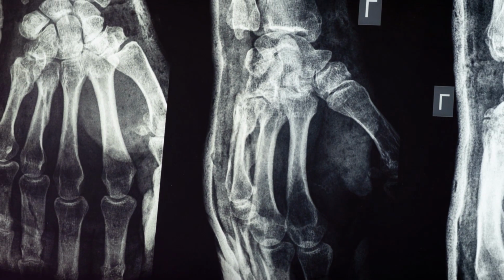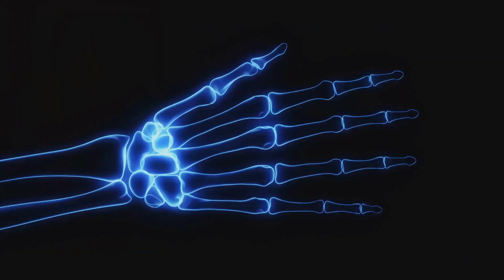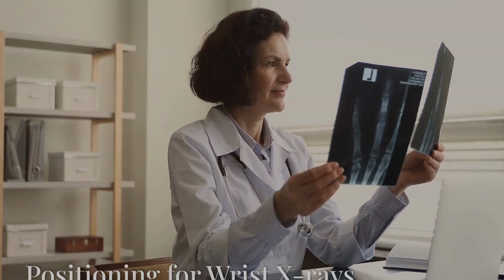Remember the names and positions of these bones. It's crucial for accurate X-ray interpretation. We'll be referring to them a lot.